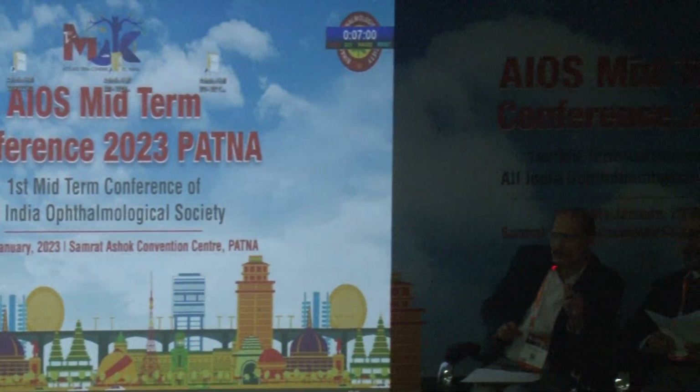So what did you actually use? You use different ways of looking at the same image, like multiple algorithms? Yeah, because your table shows like 3 or 4. No, they were regarding the retinal specialists, they are seeing the images, right?